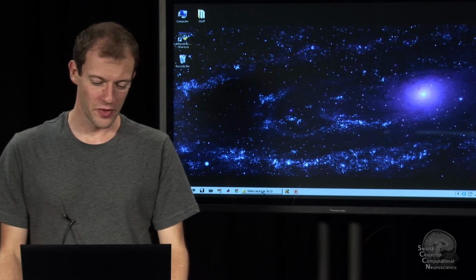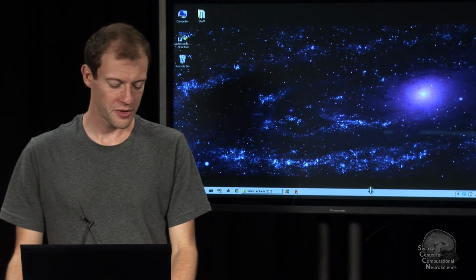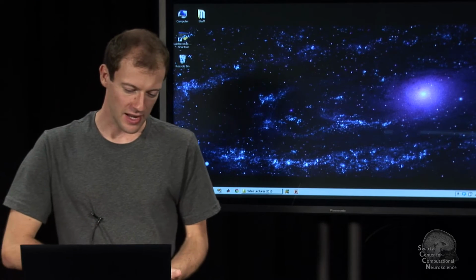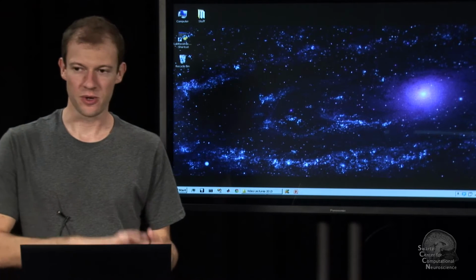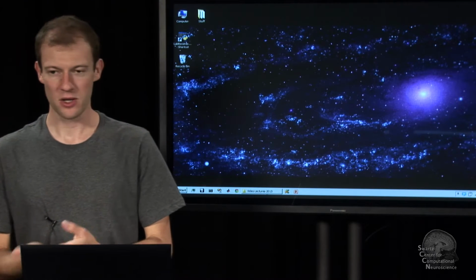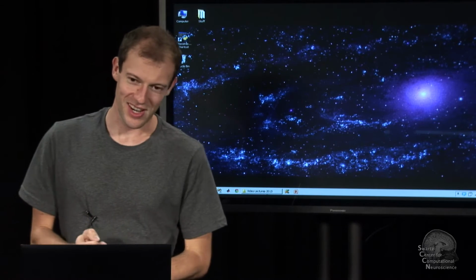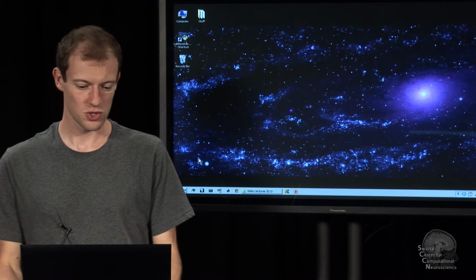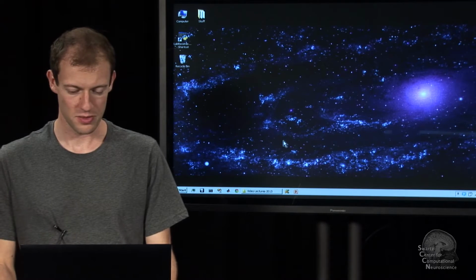So I'll now give you a little bit of a demo of how to use BCILAB. I'll start with an overview of the graphical user interface and how to use that. And I'll try to transition in time to the scripting part and show you a few of the plugins just so you get a taste of what this is about.